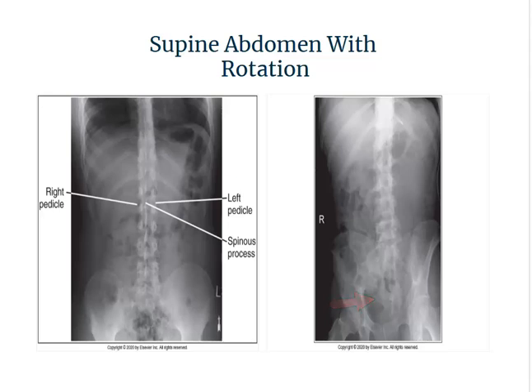If the distances from the pedicles to the spinous processes are greater on one side than the other, or an iliac wing seems to be more narrow than the other, or if the sacrum is positioned within the pelvic inlet closer to one side than the other, then there is some type of rotation.